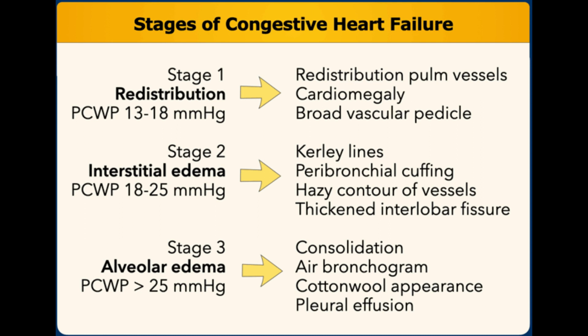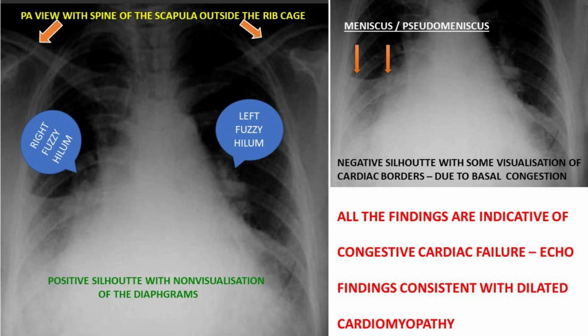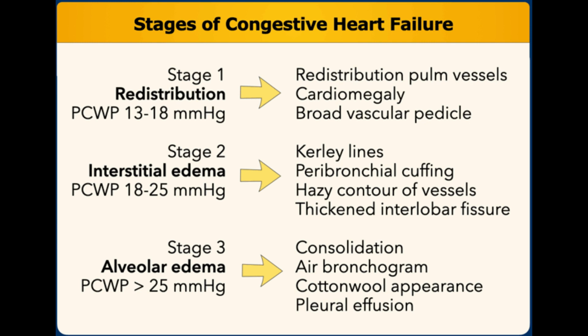We'll go to the last question, which is about the line arrowed in the X-ray chest. Yes, it's called meniscus sign. I think everybody knows, and it is usually due to free pleural effusion. All the above findings with the ECG and echo interpreted by our cardiologist reveal findings consistent with dilated cardiomyopathy, and she underwent conservative management. The patient was in ICU initially and then was shifted to the room, and within 3 days she was discharged.